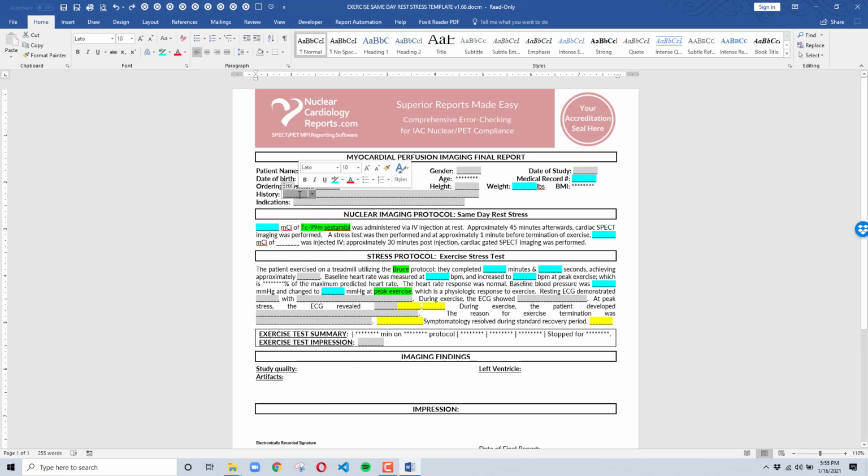So you could double click in here, as long as you make sure that everything is highlighted or a little bit darker, selected like that. You can type in here history, idiosyncratic condition not in drop down. But just make sure you double click, and I'm just going to Control Z and undo that.